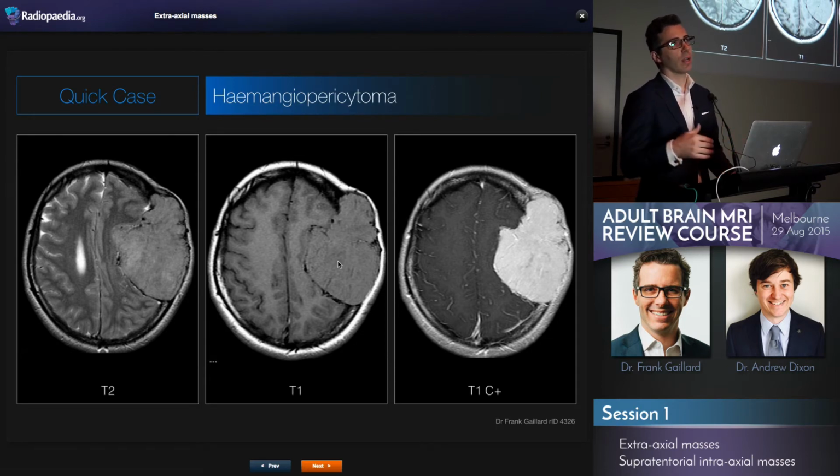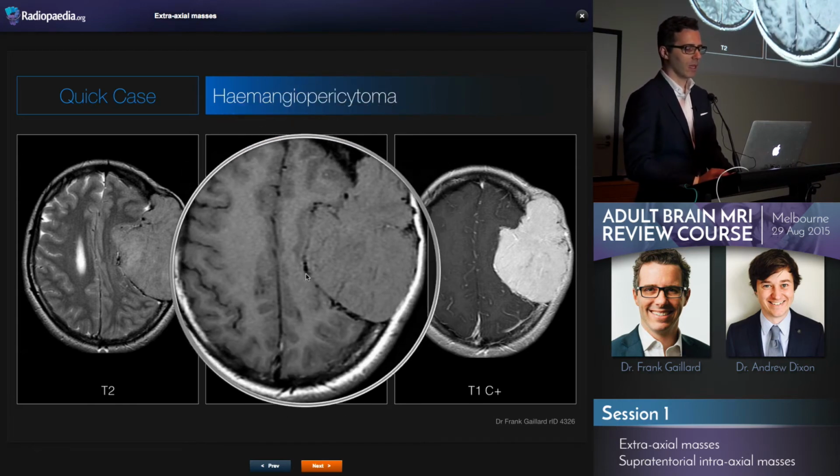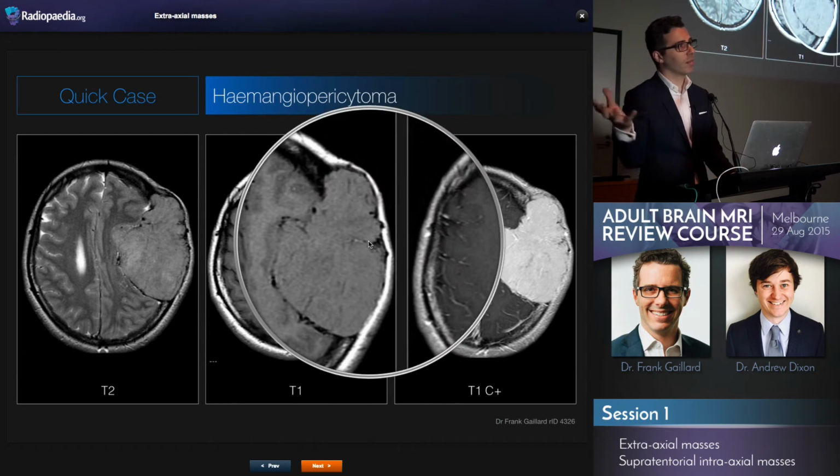it looks like this would I think about putting it number one, because it is an uncommon lesion and most of the time it'll be a funny looking meningioma. But there's another few features here that are helpful in distinguishing hemangiopericytoma from a meningioma, and that's the pattern of vascularity. If you remember, we saw that sunspoke appearance as it grew away from the dura. That's usually absent in hemangiopericytoma, with vessels being predominantly seen around the periphery, being parasitized and growing into the tumour.